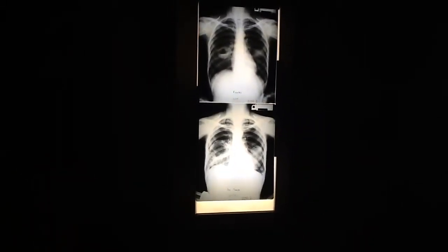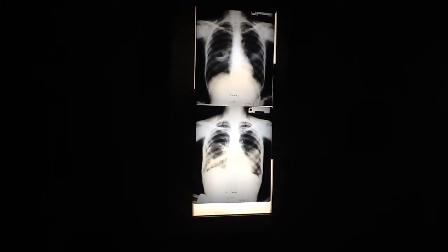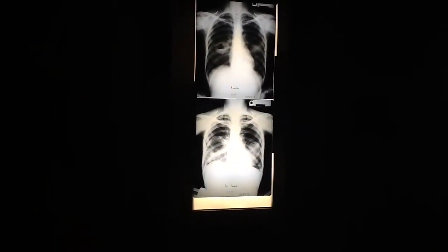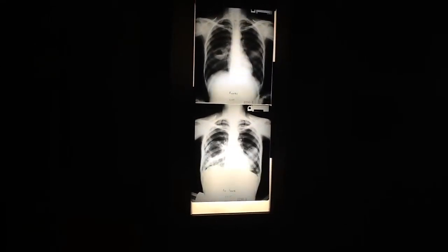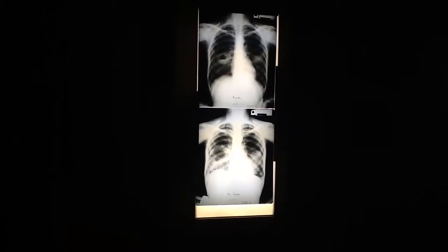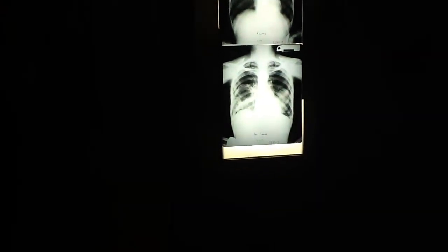And what do we have to have for a fluid level? In order to appear radiographically, what do we have to have physically going on in the lung? Not in terms of pathology, but what has to physically happen? We have to have free air, free fluid, meaning those two things, air and the liquid, have to be in an open space. And they have to then be able to do what? Come in contact. Separate from each other. Then we get this horizontal interface right here.